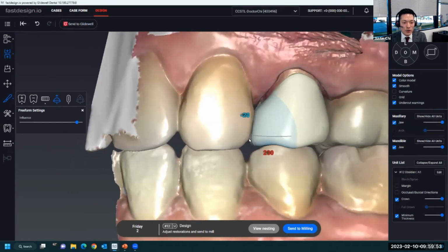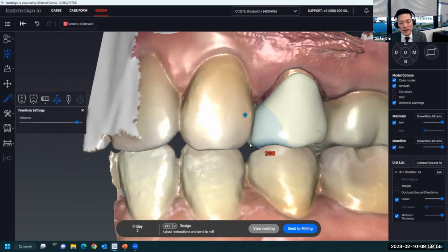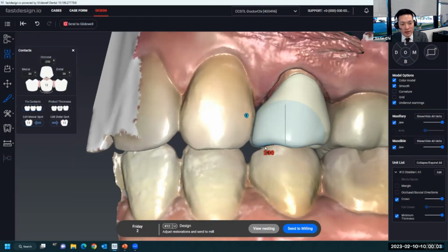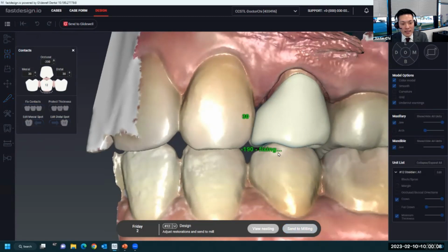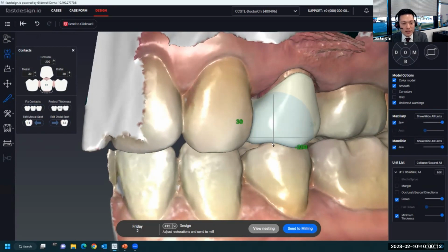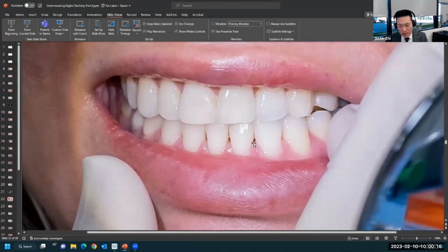And this is one of the amazing benefits of having the control in your office. So I bring this down. Let's just go back to the contacts. I've obviously made some spot heavy, so I can just give that a click. It's going to lighten the area that I just brought down. But now I have this area much more closed, and we remill this design.